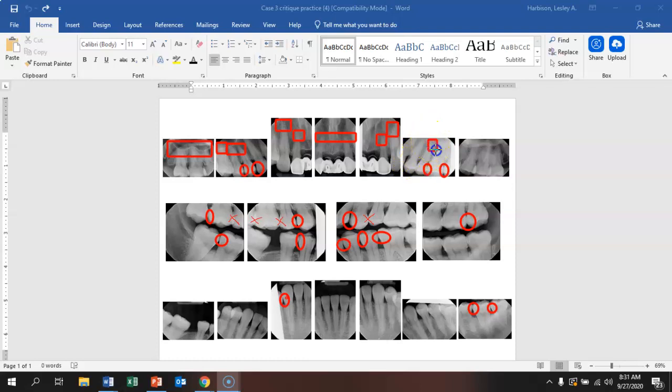Above the second premolar, it looks okay, but that's really right on the border, and the doctor would probably want to see a little bit more space, and then you could address the canine. So it could be more of an anterior shot. So let's put an X here. Let's put an X here for that one. And hopefully we could include the canine in this as well. Okay, let's go back to the box.